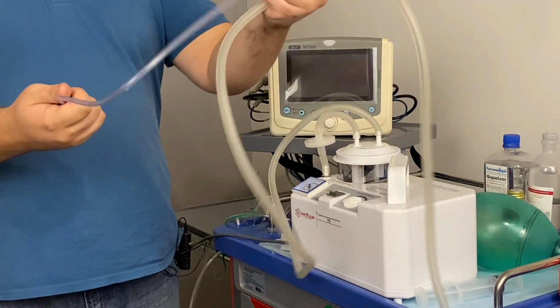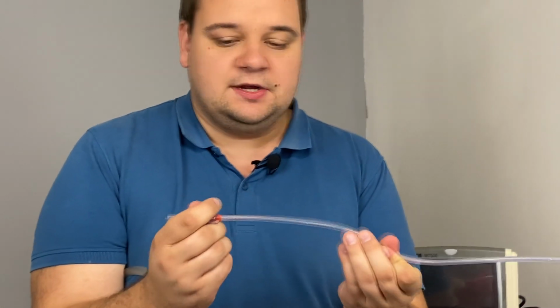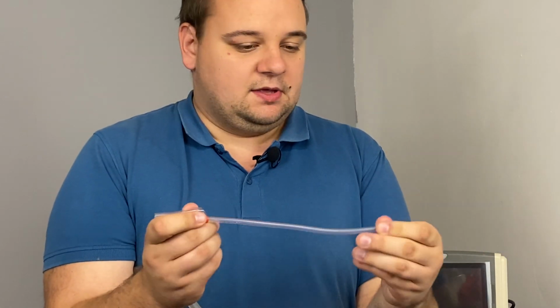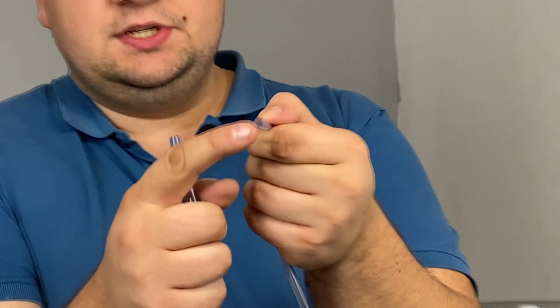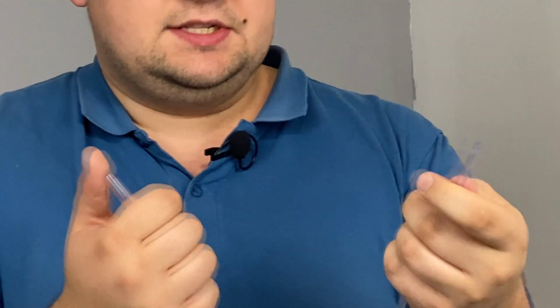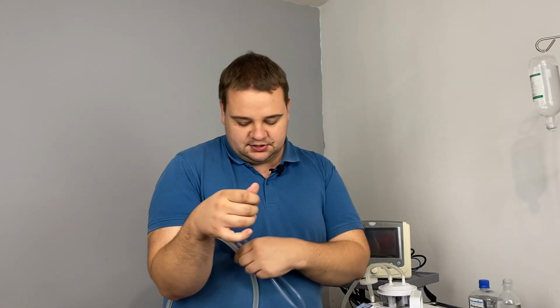So this is the general tube, and this is the aspiration catheter. We should concentrate on this thing. They are, of course, of different sizes. This one is one of the largest. They are generally smaller, but they may also have some exceptions. This is the distal part that goes inside the patient. You see that it has a hole on the distal part and several holes, in this case 2 holes on the sides. This is to prevent it from just sucking onto the wall of the patient. That would decrease the function of the device if it just sticks itself to the wall of the patient, and it will also damage the tissues that it sticks to.